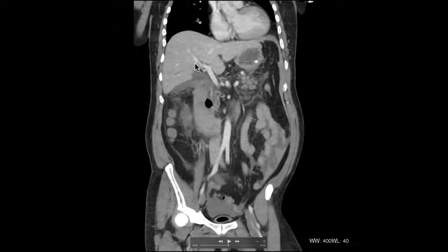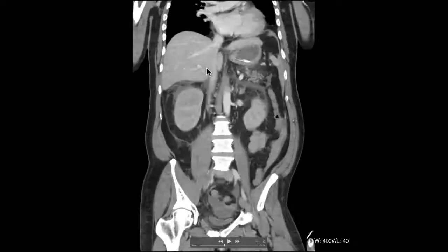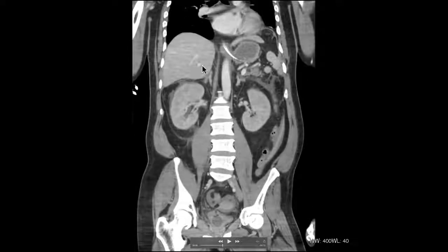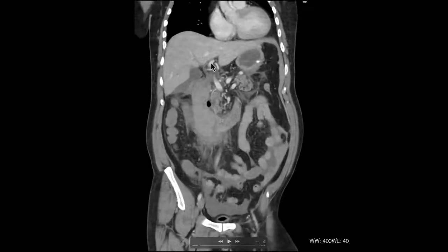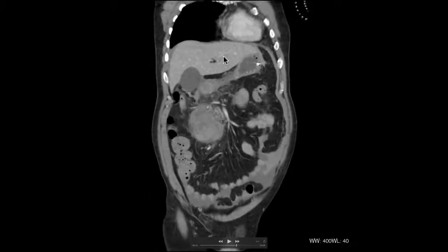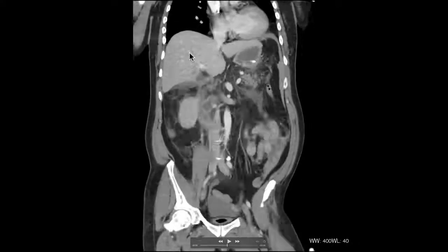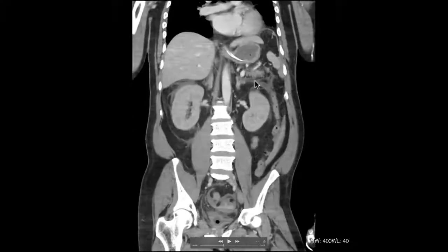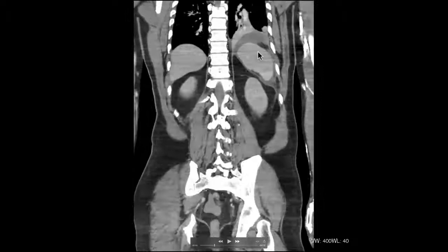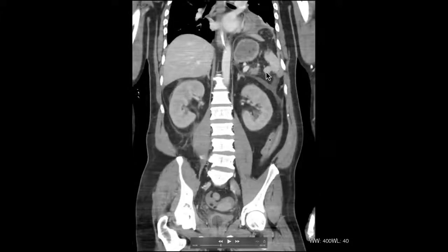Liver looks okay. You'd be worried about some biliary dilatation. You can see that's the CBD there, maybe a tiny bit plump, but not significantly dilated. And importantly, there's not really much in the way of intrahepatic duct dilatation. You can just about make out the right-sided ducts there running next to the portal vein branches. And the same on the left there. You can just about make out some small intrahepatic ducts, but they're normal. No liver lesions. We've looked at the adrenals, they're fine. Kidneys look alright. Spleen there. Occasionally you get splenic infarcts and things, but that looks okay again.